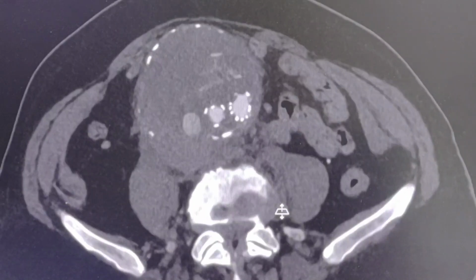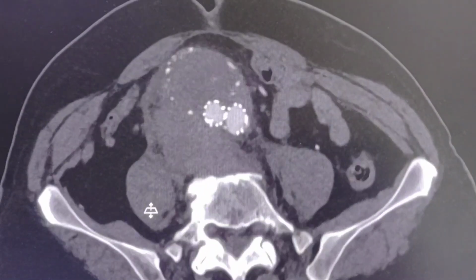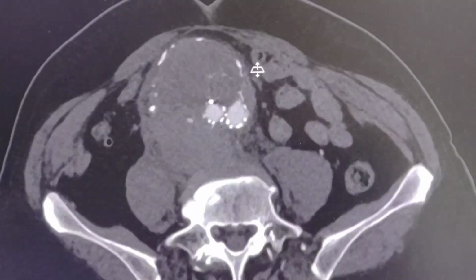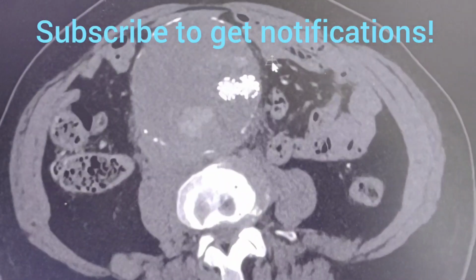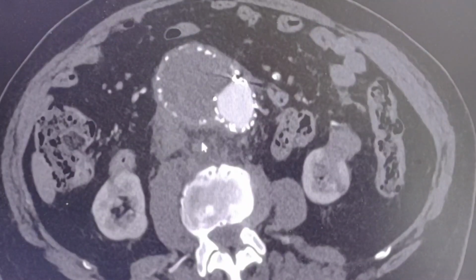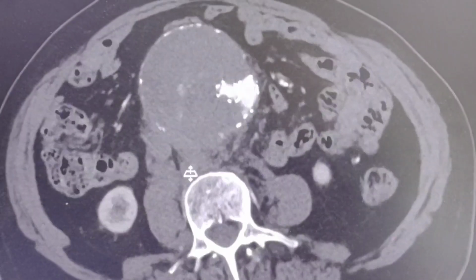We can see that the anterior contour of the psoas muscles is obscured. There is blurring around the contour of the vessel, particularly in the posterior aspect, which is also obscured. So this is definitely a retroperitoneal hematoma. We have a rupture here.